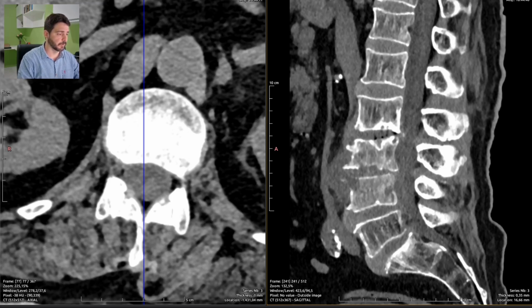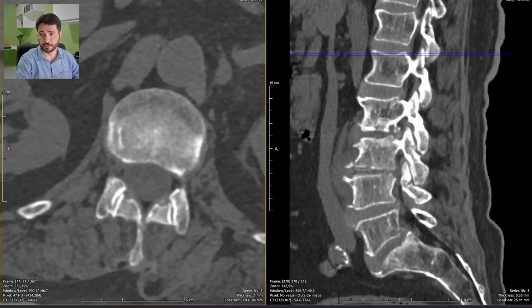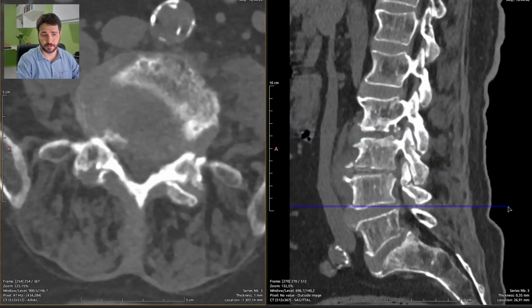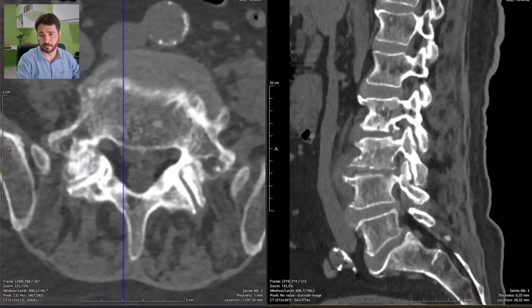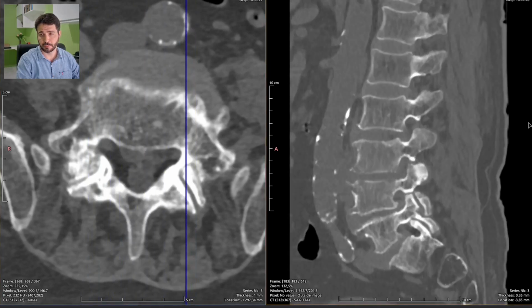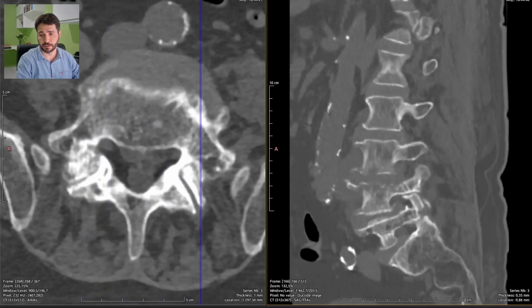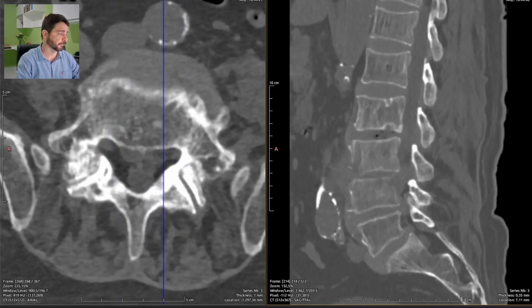So, yeah, and we have to also describe the degenerative signs on facet joints. I can say these facet joints are really bad, but the others aren't really that bad. They are quite preserved, so I'm going to classify this as moderate disease of the facet joints.